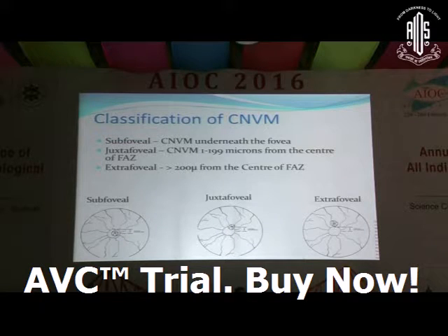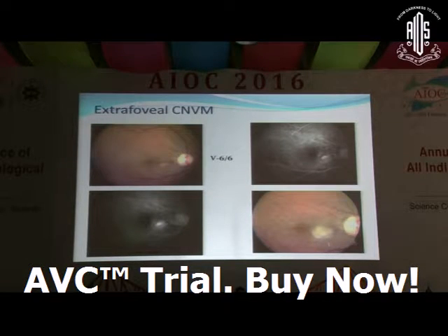In an extrafoveal lesion, you can go ahead and treat these patients with focal laser. Like you can see here a yellowish white lesion and a subretinal hemorrhage. On fluorescein angiography, you can see a classical lacy pattern of filling in the early phase, which leaks in the late phase, telling us yes, it's wet AMD with CNVM.